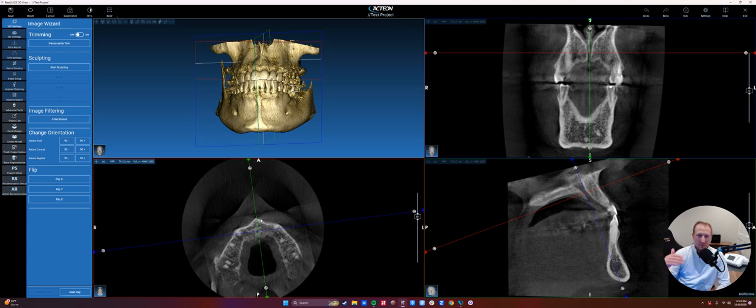So now I'm pretty comfortable that I've got the correct horizontal plane for the patient, and I've fixed any minor rotations. So this just means the patient was put in the machine, positioned maybe 5 millimeters turned to the left. Very minor, but something that I'm just going to correct here very simply, okay?